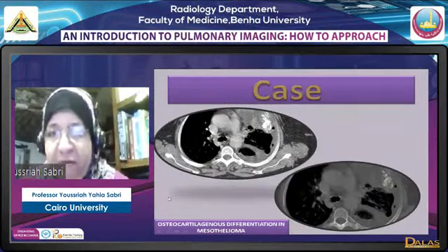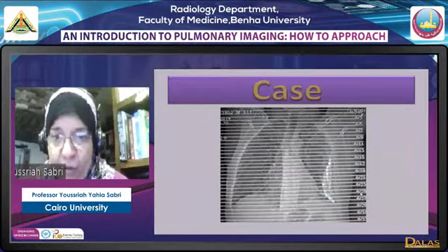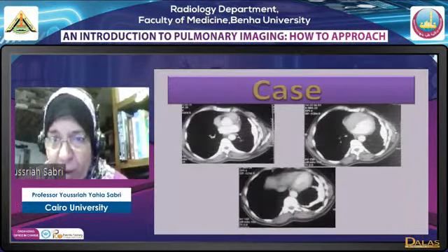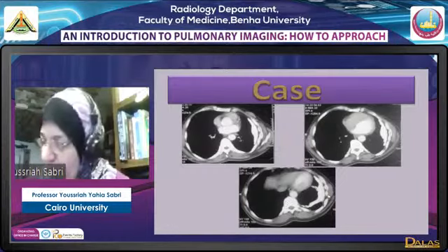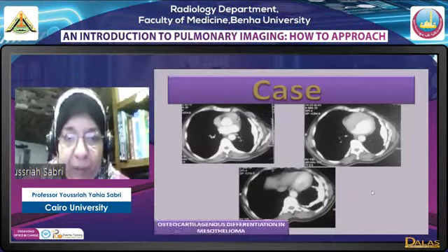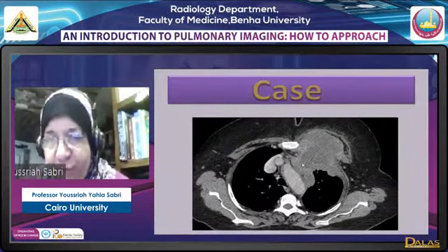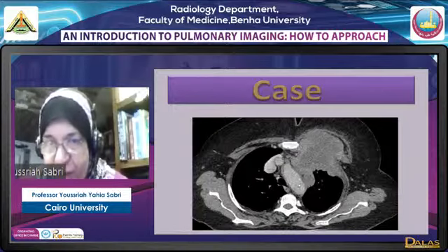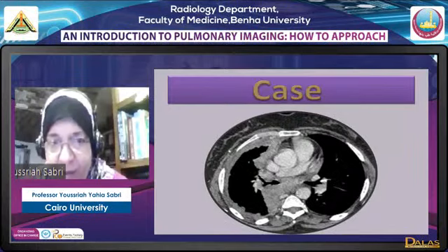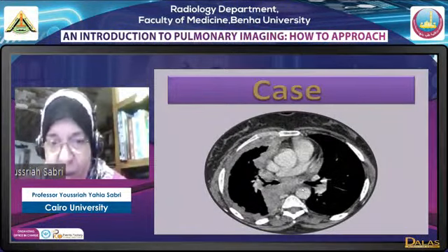And it could be very massive, as in this case. In this case of mesothelioma, you can see the affection. The whole mesothelioma has shown this pattern of osteocartilaginous differentiation, and even the fissure is affected. Now, having a mesothelioma, we have to look at the mediastinal infiltration and the chest wall infiltration. Here we have a case of mesothelioma infiltrating the pericardium, the heart, and the mediastinum, as you can see.